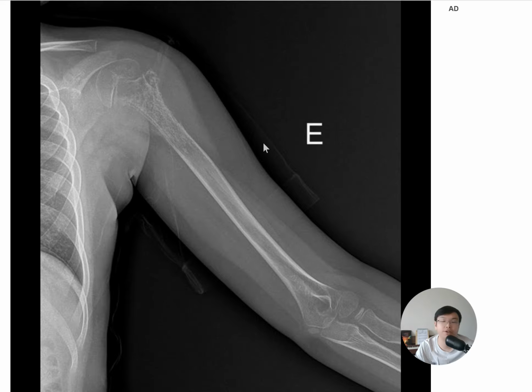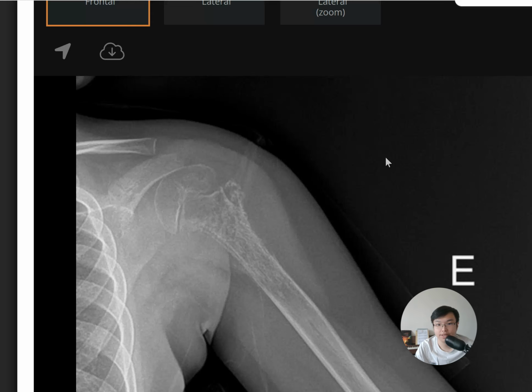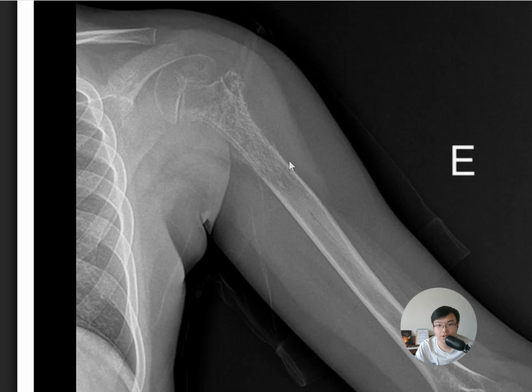left humerus radiograph. If you analyze in more detail, you can already spot that there is increase in lucency. There are some ill-defined erosions involving the proximal left humerus, including the proximal shaft region and also the metaphysis region. So how do we really assess that? Because you do not see significant bone loss, but there is something quite strange in appearance. So let me try to break it down into minor detail and tell you how you can assess that.